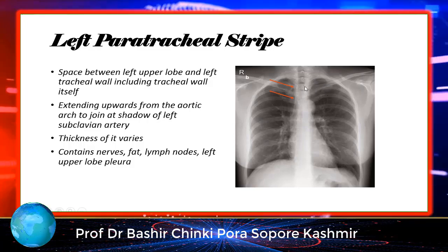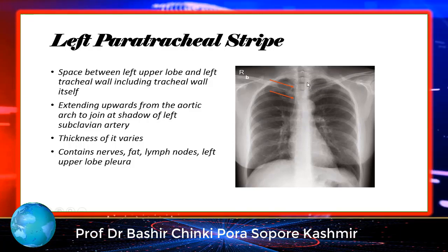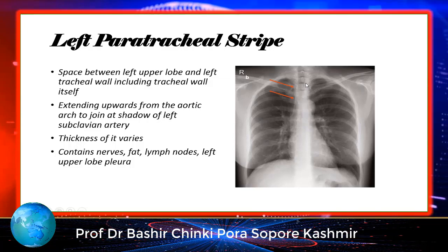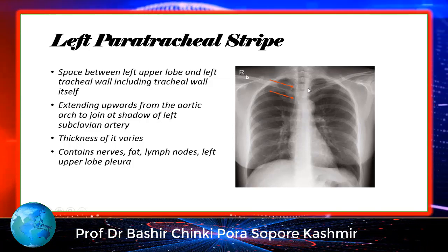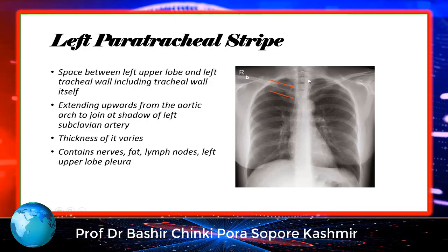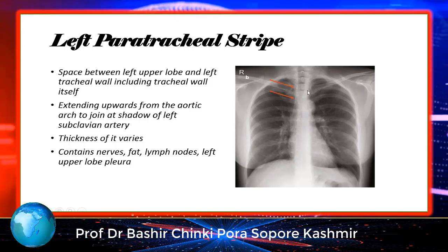So this left paratracheal strip includes the left tracheal wall, the pleura, and the intervening mediastinal fat.